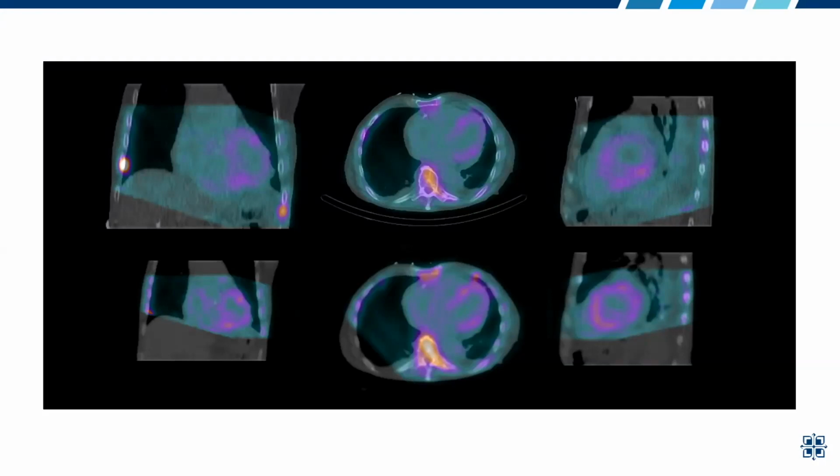Yeah, when you're processing this study, obviously, and you're looking at the planar imaging, which they've set the ratios as positive and negative, but that's based on looking at the counts in the myocardium or the blood pool to the contralateral lung. And as Dr. Sperry said, in this case, we were just kind of lucky because he had sort of this bilateral rib fractures on each side that was contributing artifact to the image.